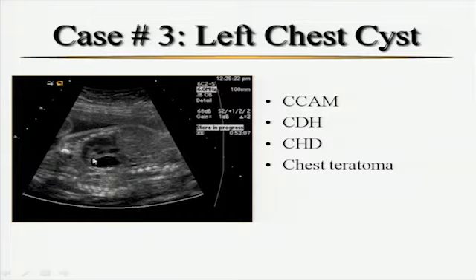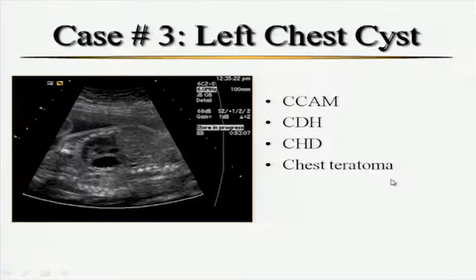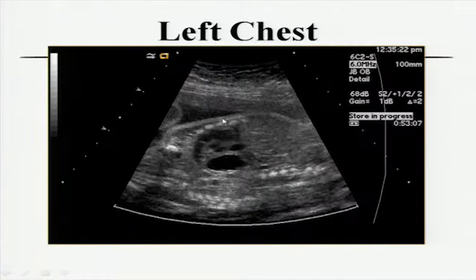On the sagittal view, we see this cystic structure. So we'll describe what we're seeing that seems to be posterior to the heart. So what would be our differentials on these? Right side, the diaphragm looks good. And the other thing I should see, if I see diaphragm here, should I see stomach below the diaphragm?